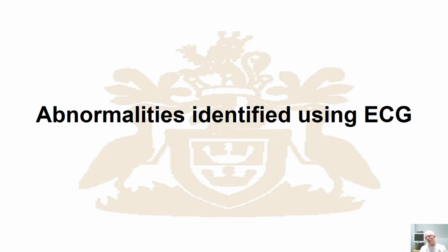So what can we actually see with our ECG? Now, we could be studying a whole course on this, so we're just going to pick on some more common abnormalities that we can see that are relatively easy to see within a trace. I mean, reading ECGs is a whole discipline in itself, and it's a profession in itself.